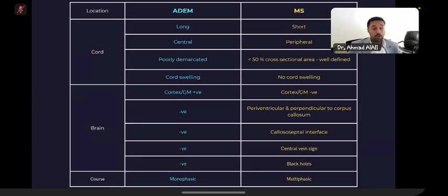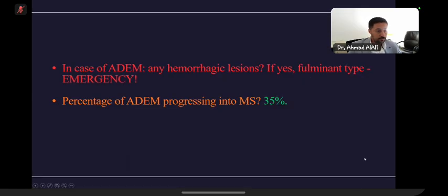It's not uncommon for young adults also to have ADEM. They can have ADEM after viral infection, after certain vaccinations. They are at risk. Of course, they are less than the pediatric population, but it can happen. And this is the case that happened here. It was a case of ADEM in the first case, and the second case is a case of multiple sclerosis.